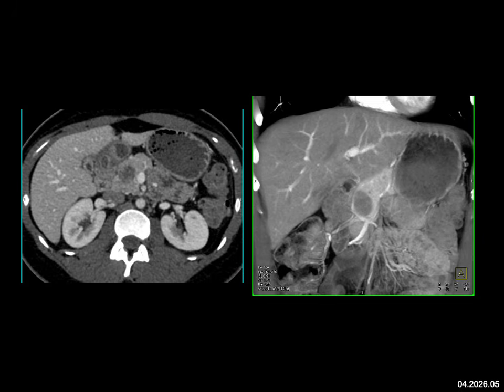It could be a serous cystadenoma. They can be small, can occur in the pancreatic head, have a range of appearances. Definitely could be an IPMN, though the borders are a bit irregular, but it can be an IPMN, and then you would worry, could there be any dysplasia? And a mucinous cystic neoplasm is more likely in the body of the pancreas, and it's usually in a 40-year-old. Now, serous cystadenomas are usually in 60-year-olds, so that's not very helpful.